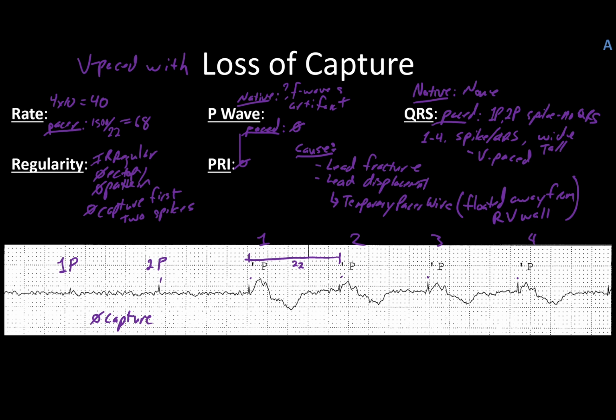So this is, again, pointing out why it's so imperative that when you have temporary pacemaker patients, especially with the wire, that they hold still as much as possible, rarely any movement. In some cases, you don't even turn them. And you have to be really, really creative with how you provide cares to these patients until they can get a permanent pacemaker placed or whatever the case may be.